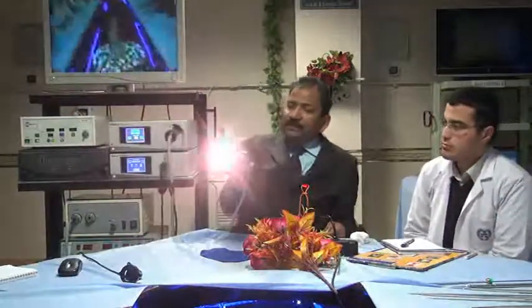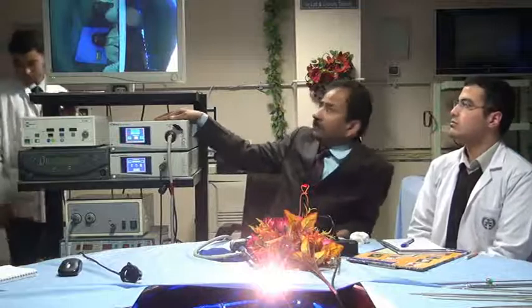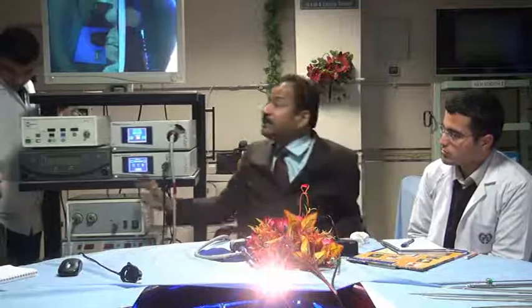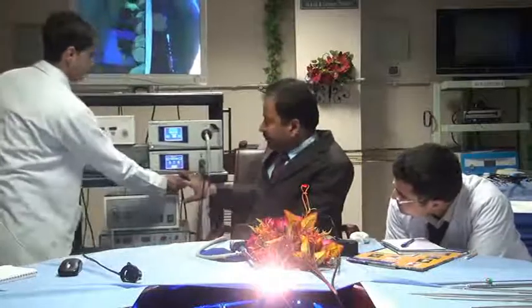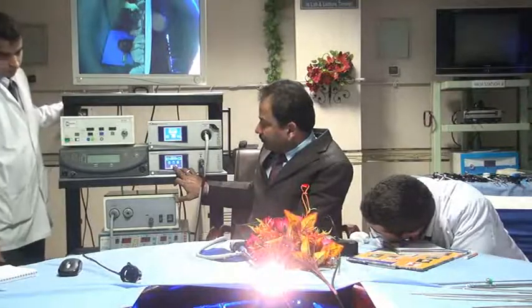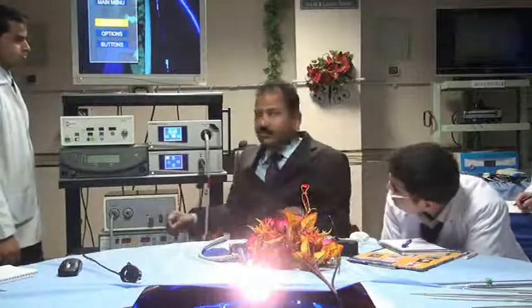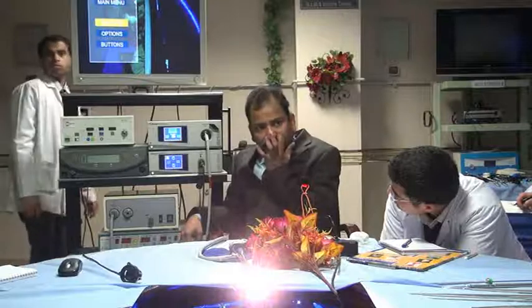Now, these are 4 buttons. There are certain features in the camera which you have to do digitally. Sorry, in the analog camera, these things are not there. Shutter. What is shutter? Shutter? Yes.